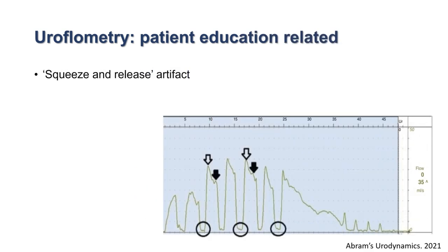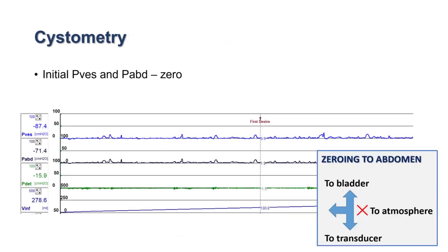There can be squeezing and releasing artifacts. In many patients with BPH, it has been a common practice to find that they will squeeze their penis so that the urethra is filled, and then they will release it to feel more confident about the flow of urine.